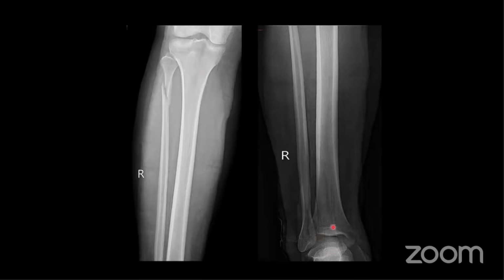And similarly, when you look at the ankle, which is admittedly a slightly inadequate view, you see an injury to the lateral malleolus and widening of the ankle mortise. So this comes back to the principle that if you see one injury on one end of this Polo mint, you need to look at the other side.